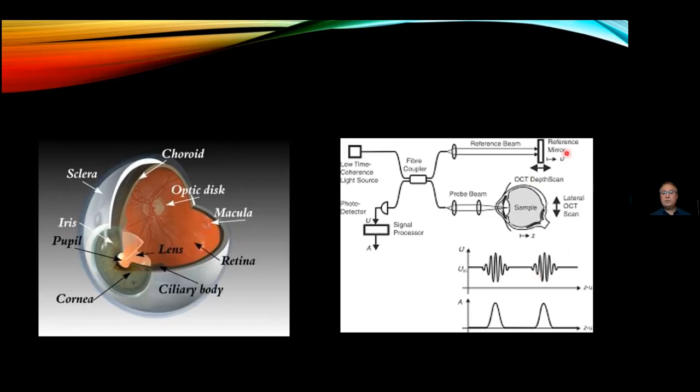And just for you technical minded, this is a little sketch that shows the principle of optical coherent tomography. You've got a beam of light that's projected into the eye. There are linear scans coming back and a computer making sense of that and giving us images.